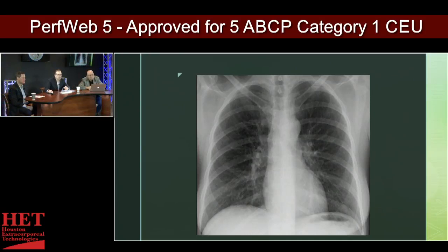But in the context of this patient, if I told you they came in acutely with abdominal pain, epigastric pain, and you see that plain film, you could think this is free air under the diaphragm. Therefore, they may have a perforated ulcer in the duodenum or the stomach.